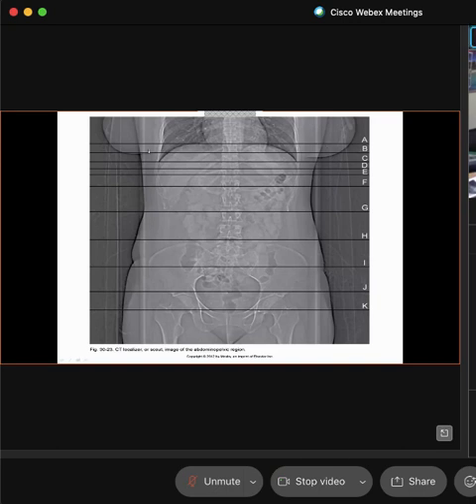As we start to descend inferiorly, we see less of these spaces, and we're going to start encountering more tissue. So if we start to separate these axial slices from each other, we're going to be able to determine where we're at from what we see and what we don't see.